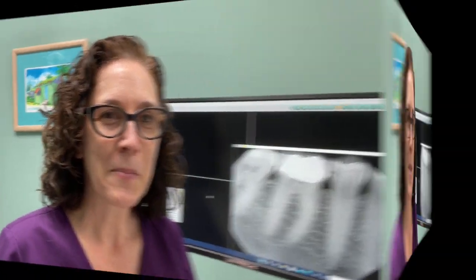So I gathered some X-rays because I thought they might show a really good example of a lot of the different ways that we can use them and different things that we can see by using X-rays. The first X-ray here is actually one of the main reasons that we use X-rays, and that's to be able to see decay that's in between teeth. When you have two teeth that are coming up against one another, if you have decay in between the two teeth, that's a place that's really not accessible to us. So the X-ray shoots a picture through there and allows you to see that image.